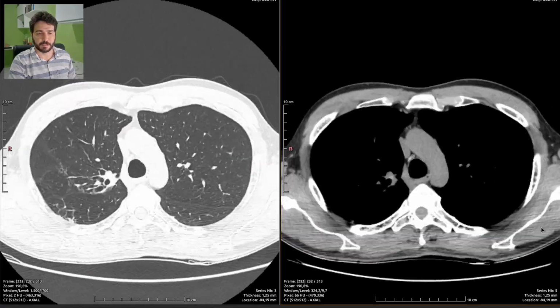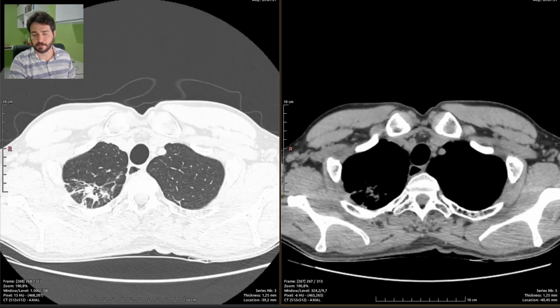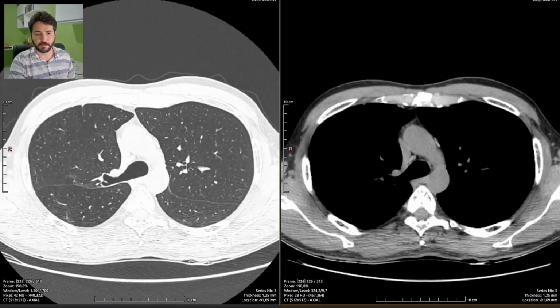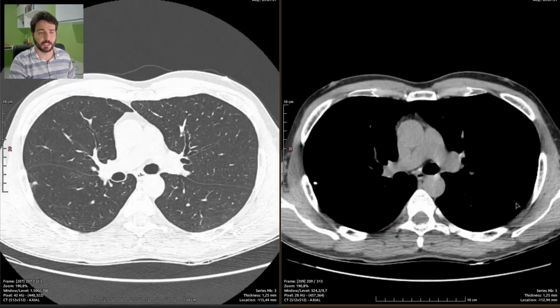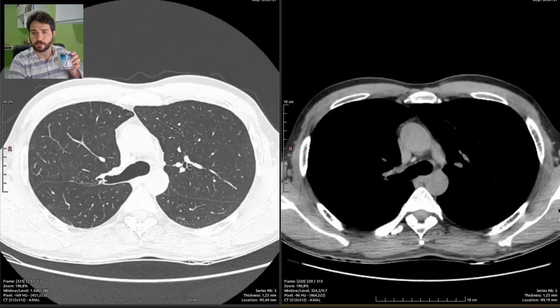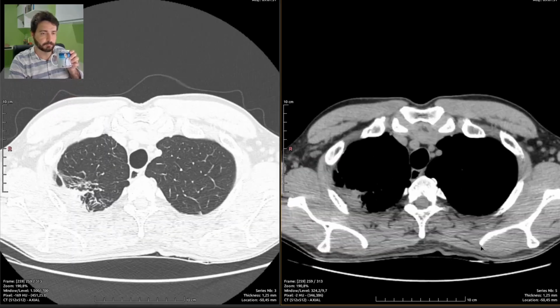by tuberculosis. So tuberculosis usually hits the apex of the lungs and the superior portion of the inferior lobes as well. This is the most common presentation. It is really common for tuberculosis to be asymmetrical in presentation. So you can't really expect the disease to be equal or very similar on both lungs.